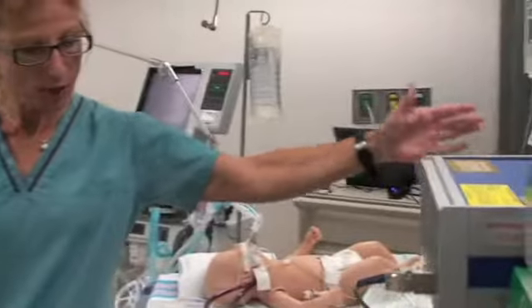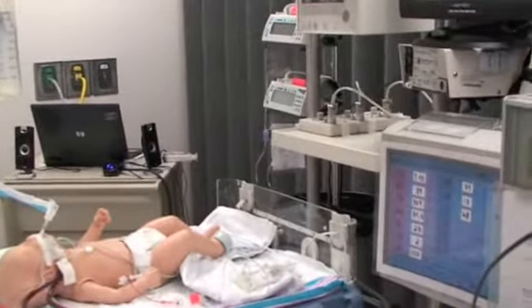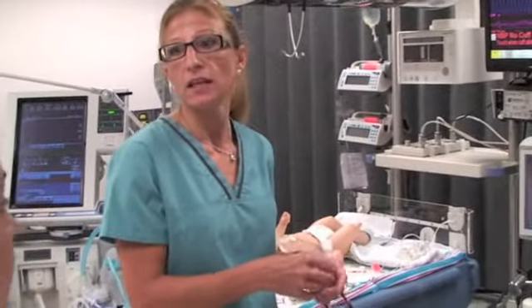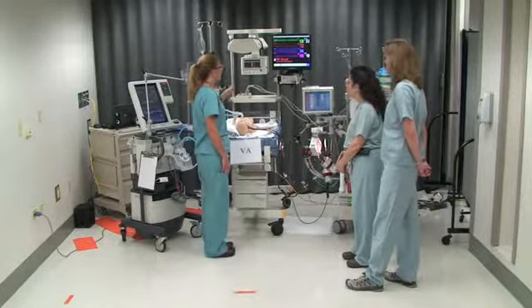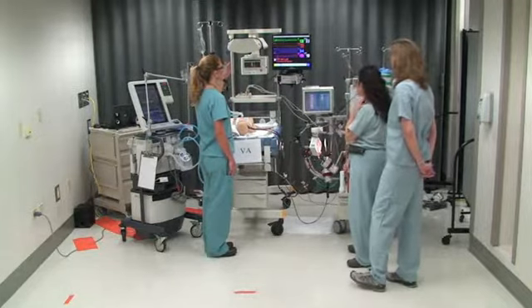We have all of your pump components here. Again, our circuit as we would set it up in our program. We're going to provide you an opportunity to have hands-on time with the circuit. This will be your chance to get your baseline, what's normal for this setup. You will have a monitor which will give you real-time feedback for your physiological parameters.